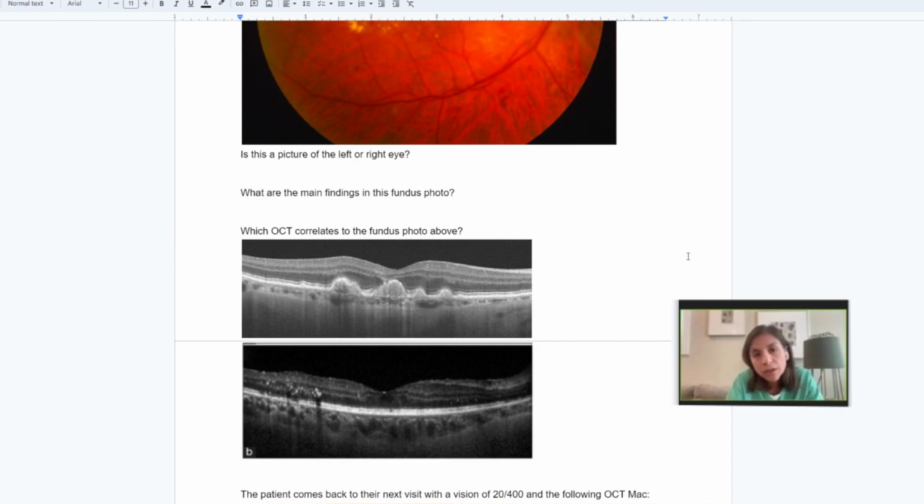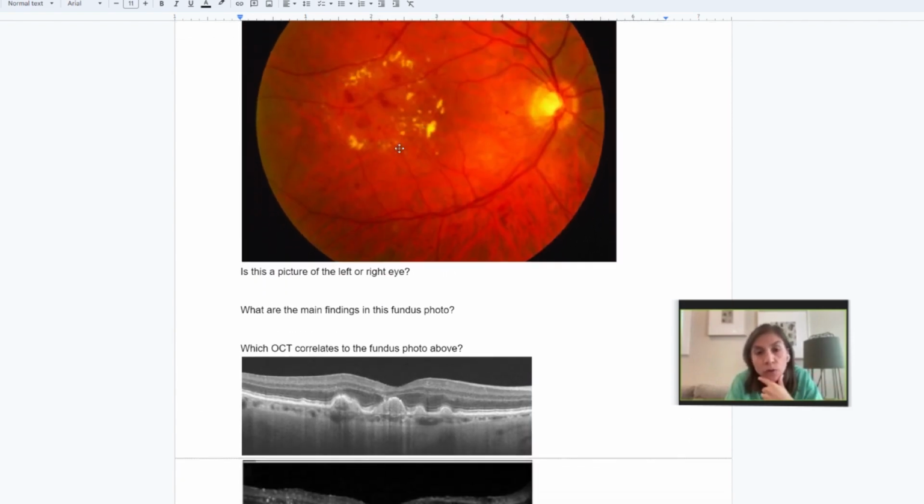And as you describe, how it looks roundish, those hard exudates on the picture above, those are usually called circinate exudates. And most of the time, those circinate exudates will encase a little bit of fluid inside. But again, sometimes it's already flat, and those lipid deposits, the hard exudates, can last for years. So it's hard to assess if it's acute or chronic just based on the exudates.